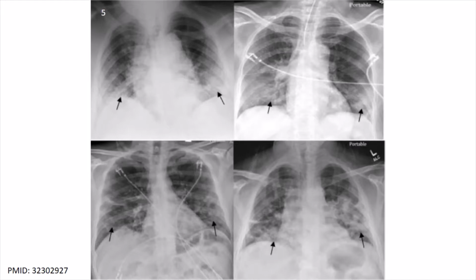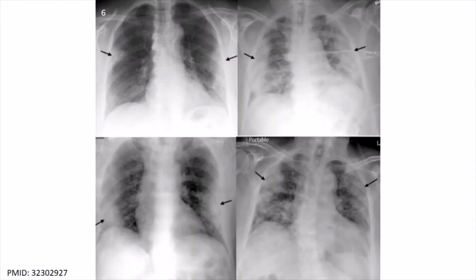on chest X-ray. One of the most unique and somewhat specific features of COVID-19 pneumonia is the high frequency of peripheral lung involvement, often mirroring other inflammatory processes such as organizing pneumonia. Almost 40 to 86% of COVID-19 chest CTs had peripheral lung distribution. Such peripheral lung opacities also tend to be multifocal, either patchy or confluent, and can be readily identified on chest X-ray as shown in Figure 6, black arrows.